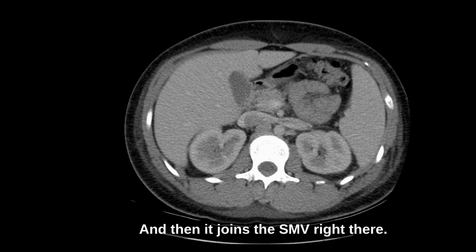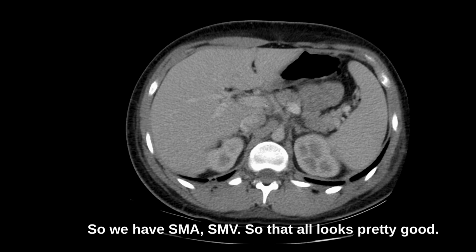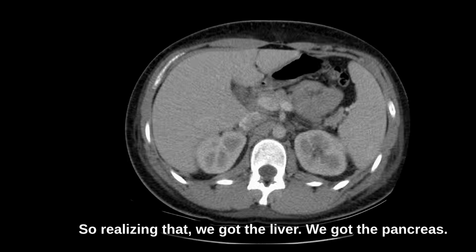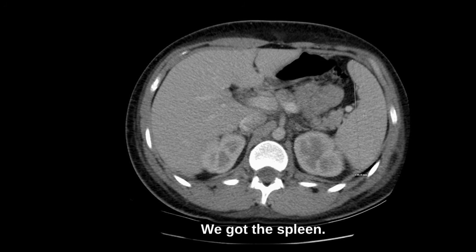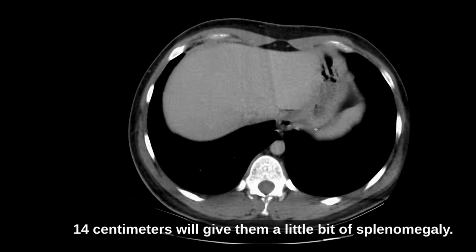And then it joins the SMV right there. So we have SMA, SMV. So that all looks pretty good. So realizing that, we got the liver, we got the pancreas, we got the spleen. Maybe the spleen's a little bit big, 14 centimeters. We'll give them a little bit of splenomegaly.